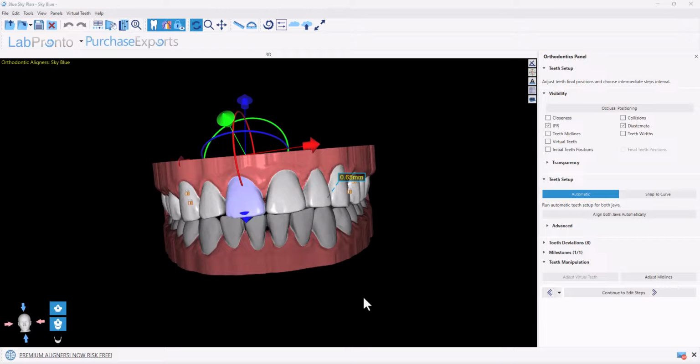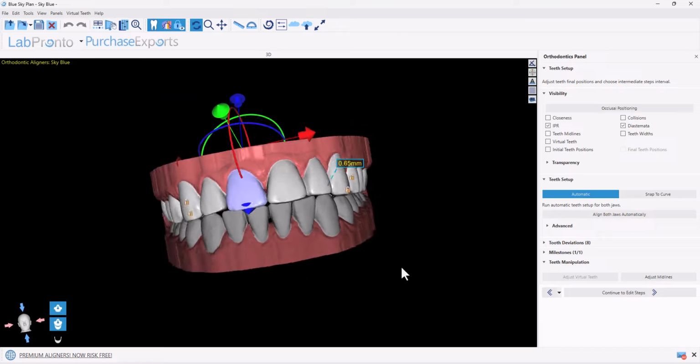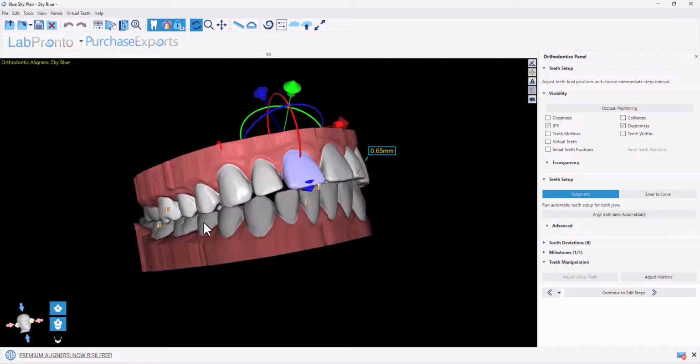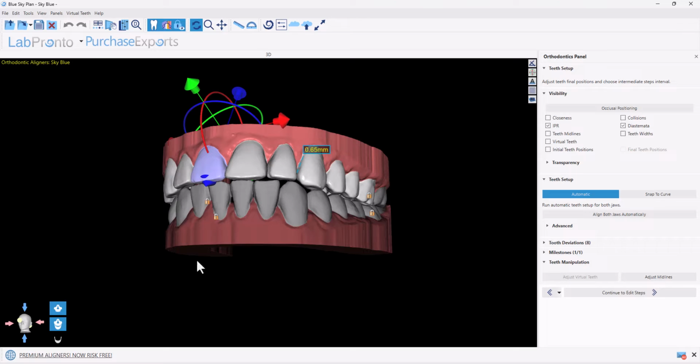So our new automated flow in aligners automatically annotates segments, cleans up the models. It does everything for you automatically. Now, if you get to this step and you realize that there's an issue or you want to go back and modify a step in the process, then from this back arrow, you have a drop down that allows you to go back to a particular step.